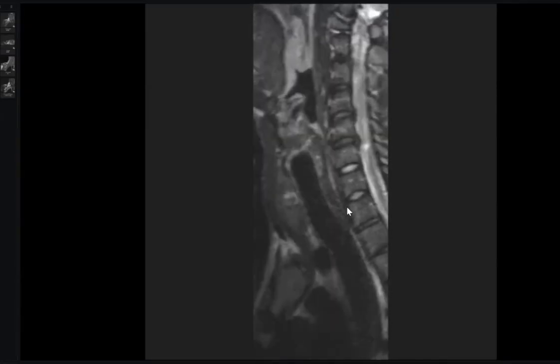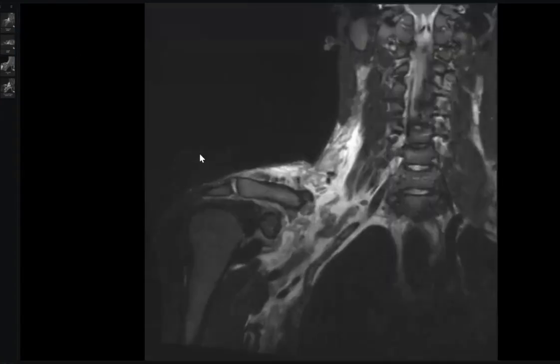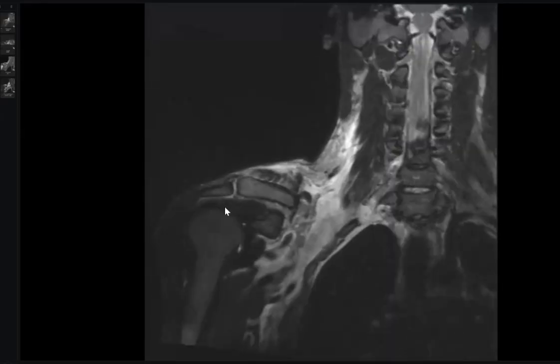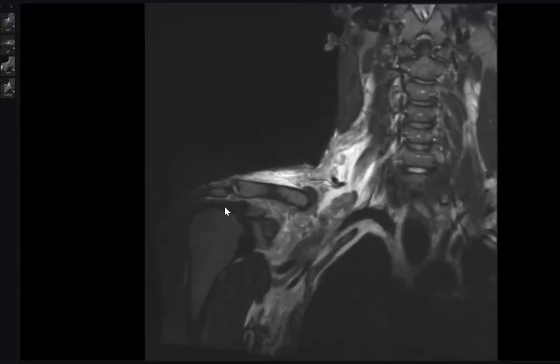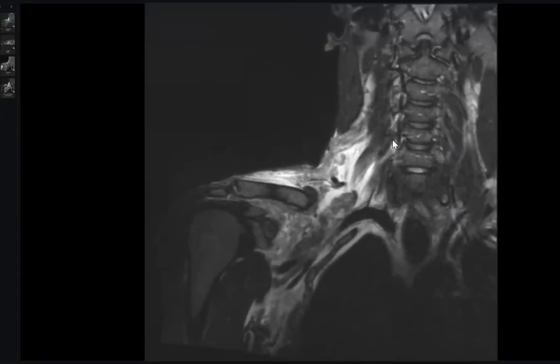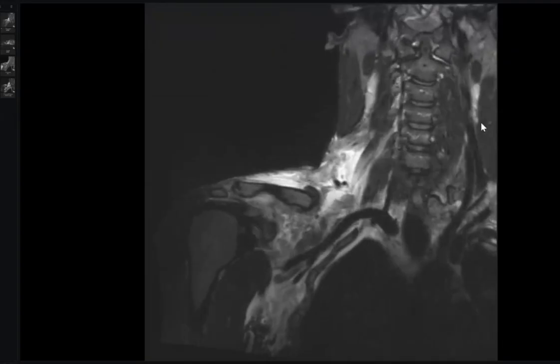Second point, you can bring the coronal and look at the neural exit. Look here. This one is filled with fluid and you can barely see any nerve. How can you be sure? Compare with any other foramen. I will show one. Look at this one. This is a nerve. This is intact. This one is intact, but compare the lower one. It is difficult, by the way.